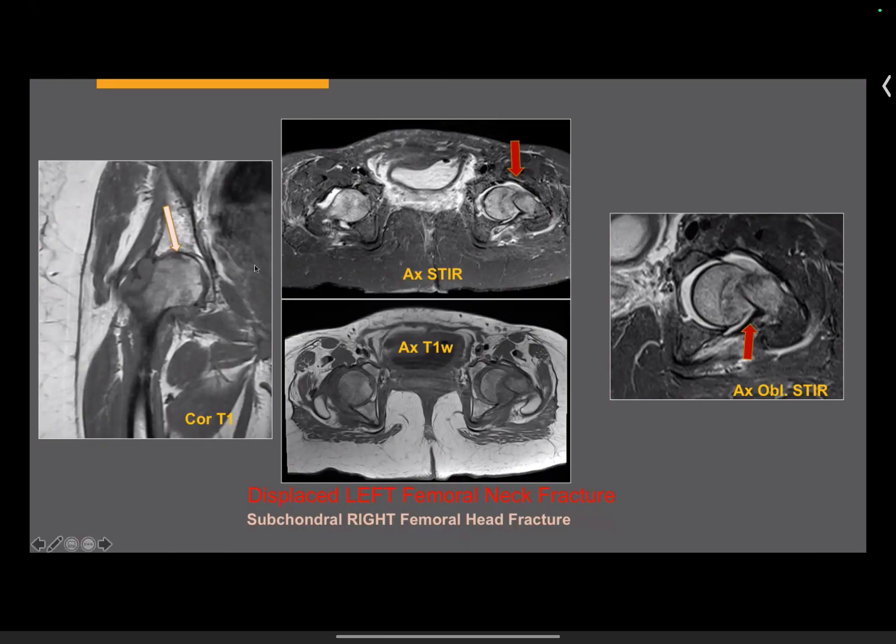But the other thing is, if you look, the marrow edema is quite disproportionate. You might say that there is a fracture, that's why there is edema, but look at the edema on the other side. And when we talked to the clinician, they said the patient had pain for a few months before delivery. So these are typical findings of transient osteoporosis of pregnancy complicated with fractures. And why do I say that?